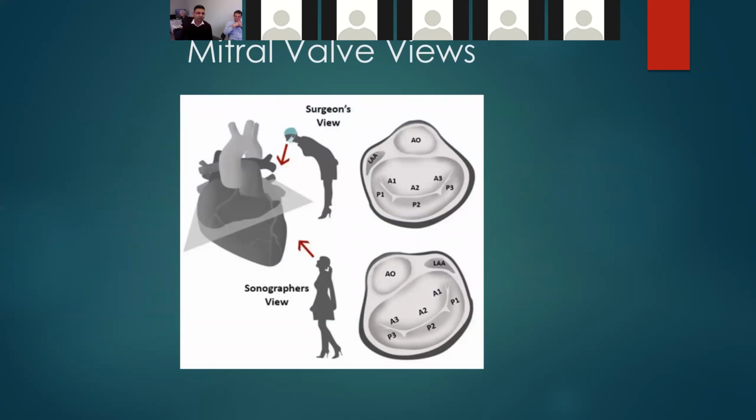You can see the top one, that's how surgeons look at it, and that's how we look at the mitral valve. The only difference is medial is lateral and lateral is medial for the surgeons. So I'm going to spend more time on the sonographic view.